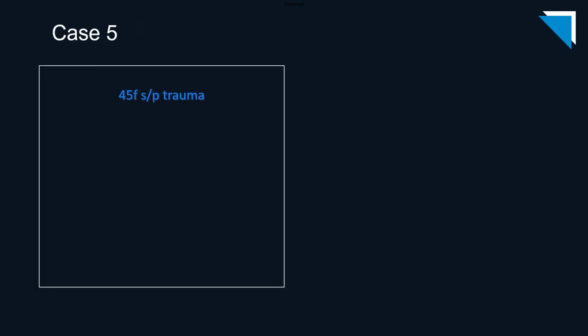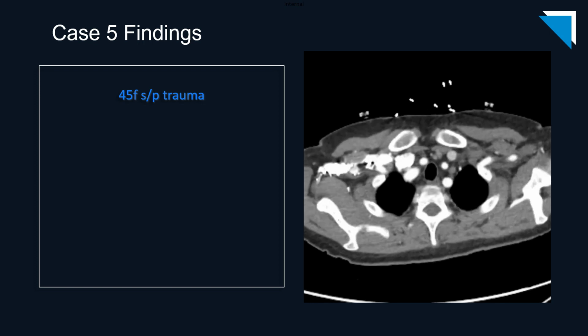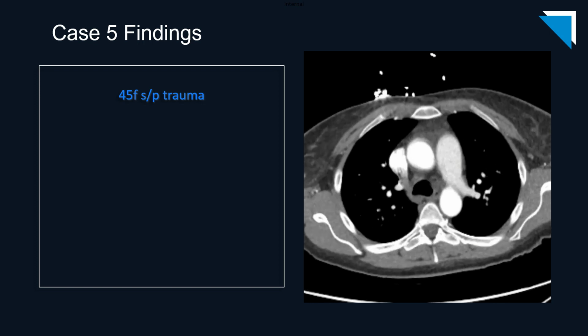If you are interested in further reading, this article gives an excellent overview of pulmonary arteriovenous malformations. Our next case is a 45-year-old woman, status post-trauma. These are axial images from a contrast-enhanced CT scan of the chest.